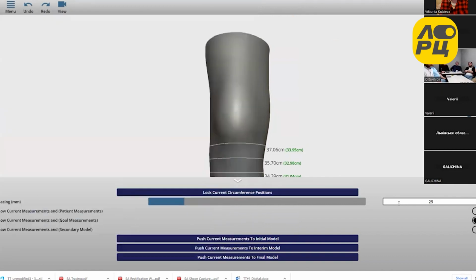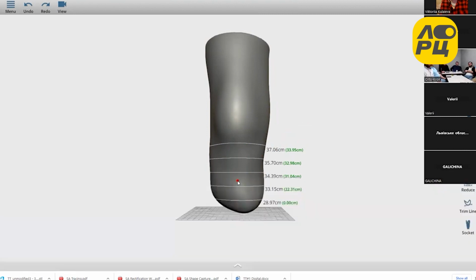So you can go in and change these settings. You can move the measurements around. We're not going to worry about that right now. At some point, you should just do a sample one yourself, change all the settings, and learn from trying.